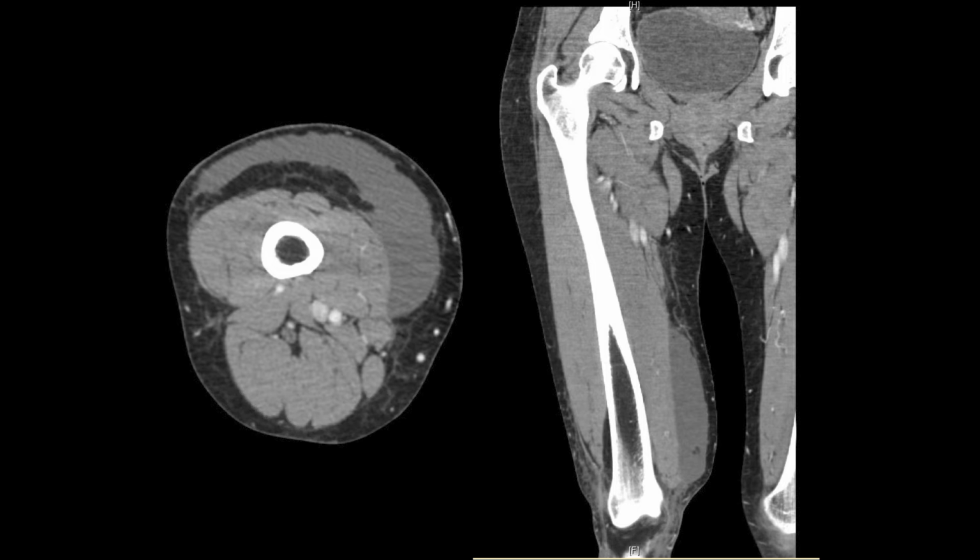And so all of these clinical findings, all the ultrasound findings, all the CT findings that we're looking at here are consistent with the entity called a Morel-Lavallée lesion, right? This is something interesting, something we see from time to time. I've certainly seen a couple of these over the course of my career so far. It has some interesting implications for management and for long-term follow-up that we should be aware of. So I think it would be good for us to talk about it.